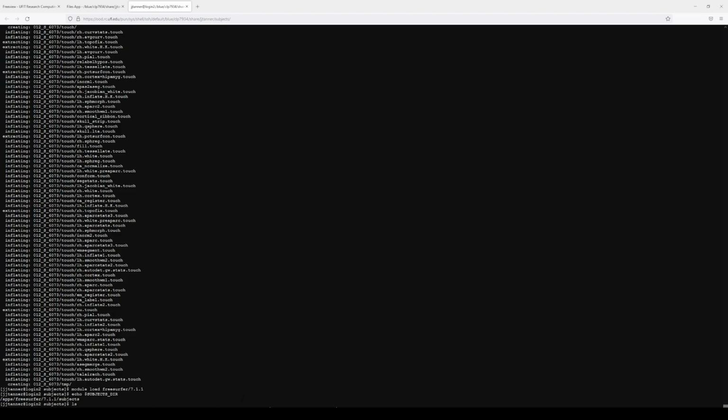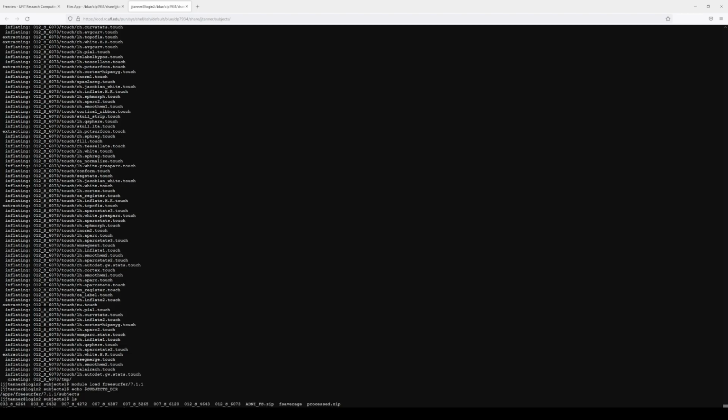So in my case, I'm going to export subjects dir to my current directory. There are multiple ways to do that. I can do blue CLP7934, I can do that whole path, or I can use the $ sign and PWD in capital letters like that. So now this is a variable that stands for present working directory, and I can do that. And what that will do is it'll set subjects directory.